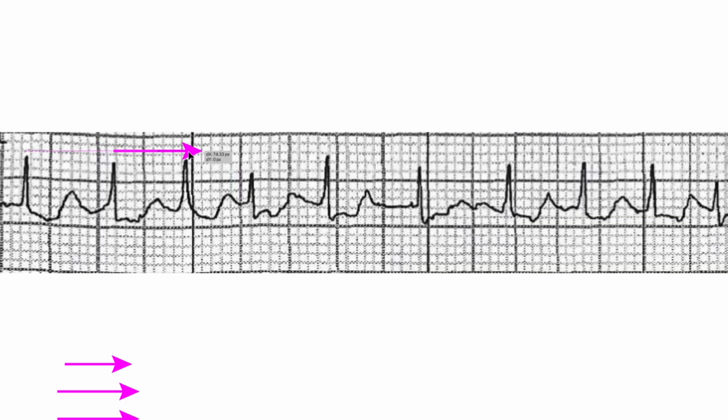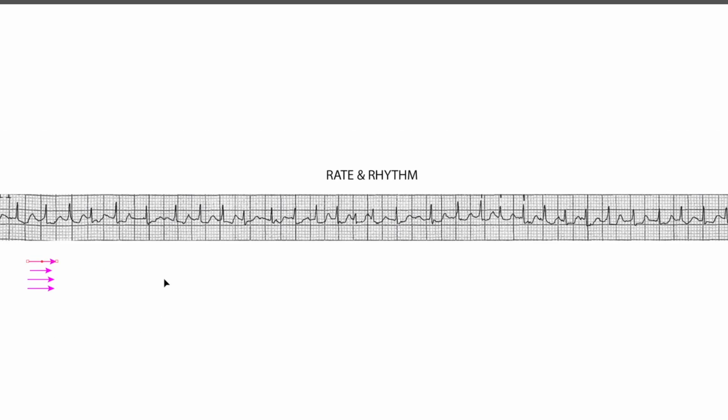So I just want to kind of measure things out. And you can see here that this is an irregular rhythm, right? Every so often you get the same R to R, but if you don't have consistency there, it only supports the fact that you have an irregular rhythm, which immediately makes me think about atrial fibrillation.